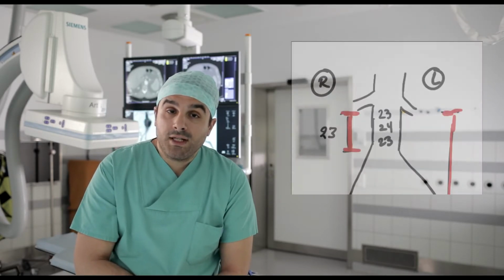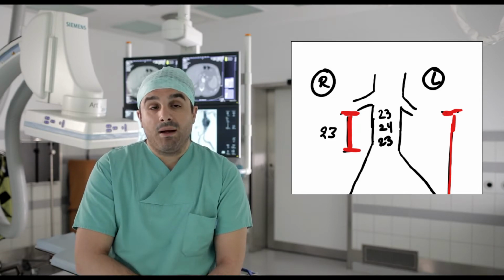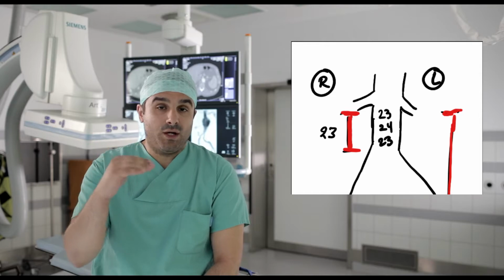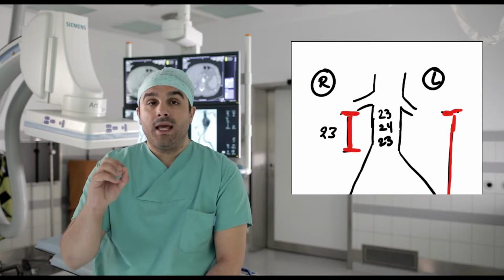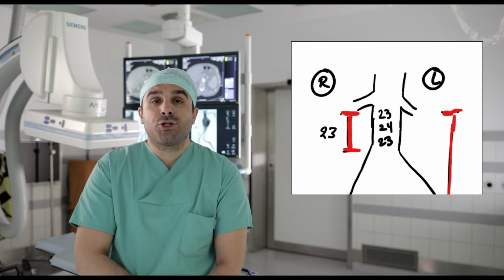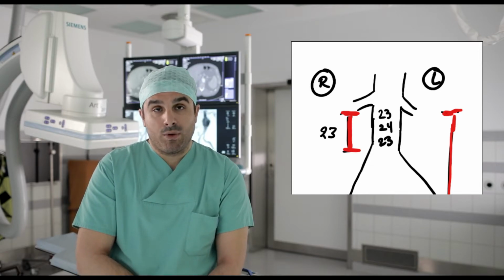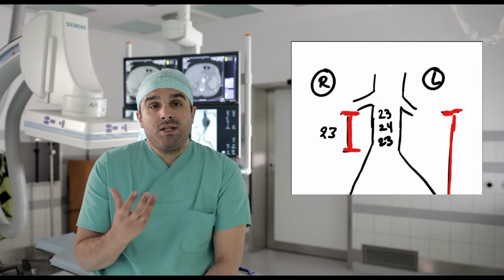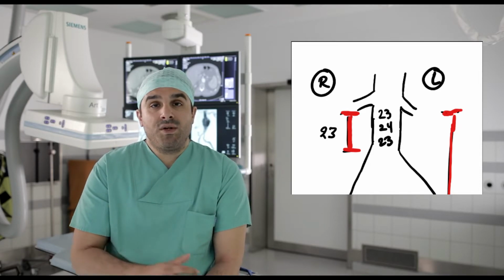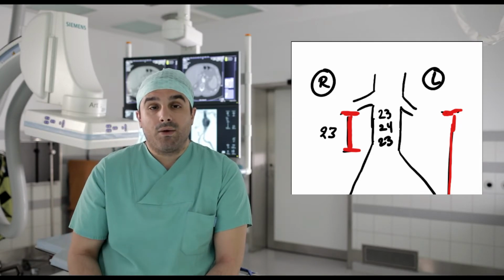The third important issue is to measure the distances and the diameters at different levels of the aortic aneurysm. Start always by the proximal neck. In this specific case that I have already shown, the supra and infrarenal angulations do not play a relevant role because we are talking about a straight neck. You are starting measuring the diameter below the lowest renal artery and then you are going up to 10 millimeter. In our case, we have a very friendly anatomy.